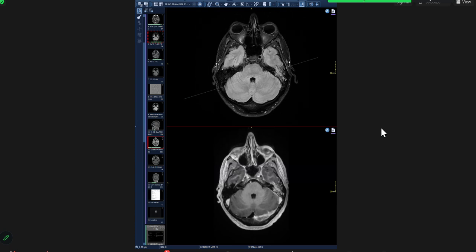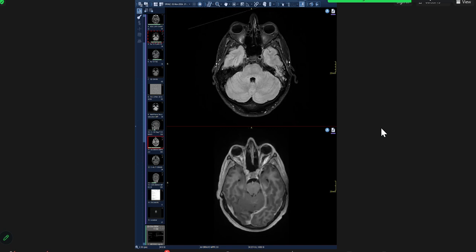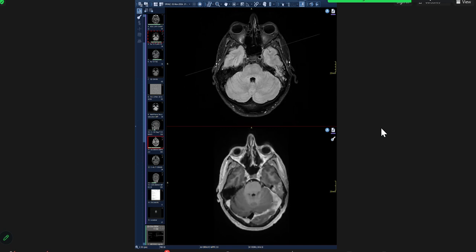When you have these infective processes, you could have dural sinus thrombosis as a complication. You have to search for the cause. Sometimes it is just sinusitis. And here it was mastoiditis, because he has a severe mastoiditis. And then you see all this extension going into the temporal lobe.